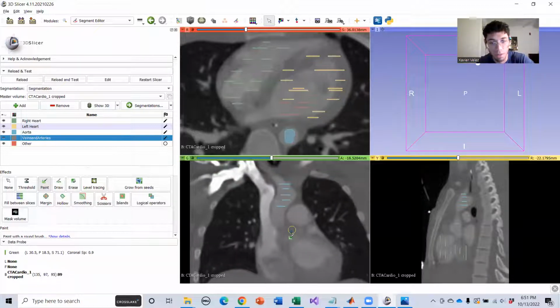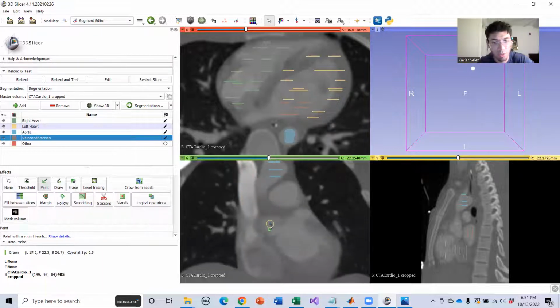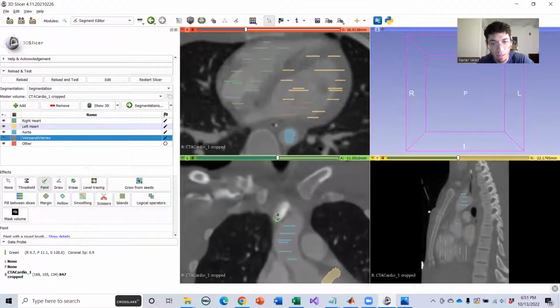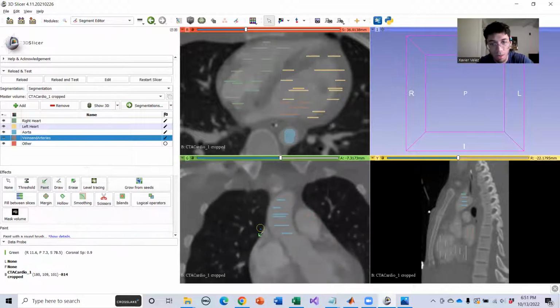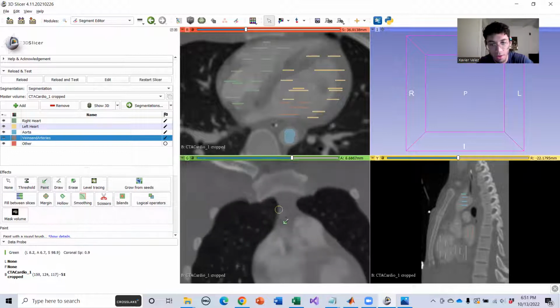This part is all about just grabbing what you can, and then you'll figure out if you need it a little later on. So we'll grab that too. I mean, we're just grabbing everything. Okay, and it's looking like that, and maybe that are most of what's left there, right?